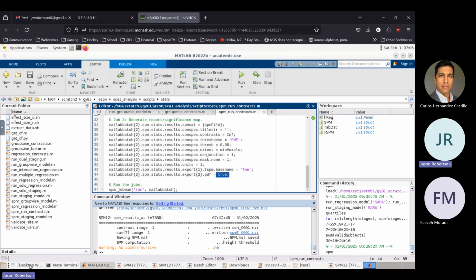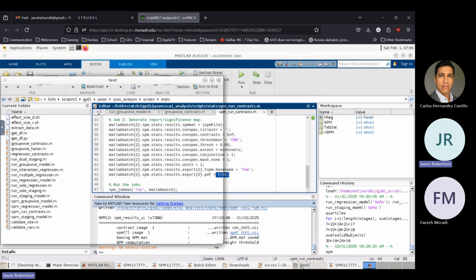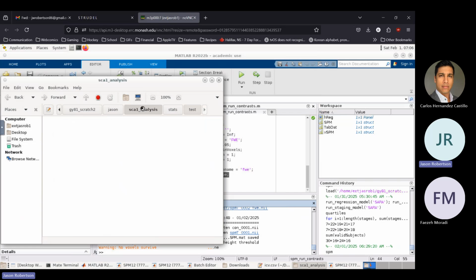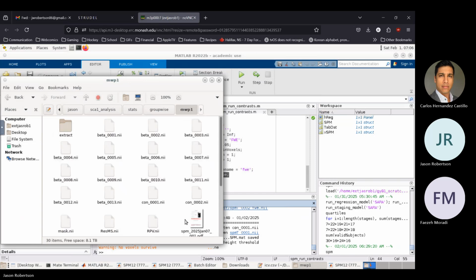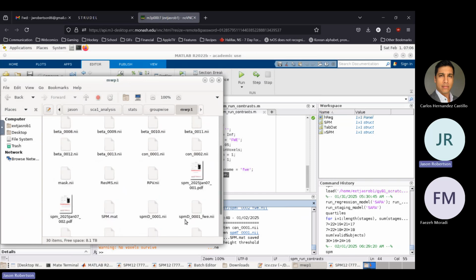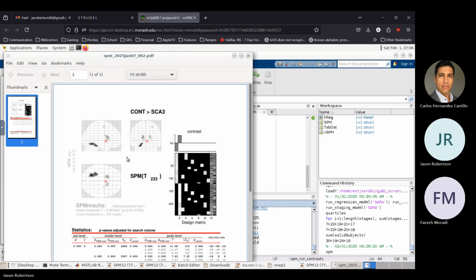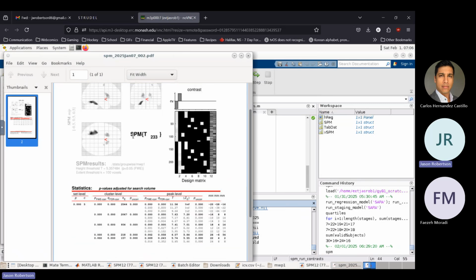And this will tell it to save the output as a PDF. And so we go over to what I got out with the analysis I ran with the scripts. You can see I've got the prop files here, and I've got the PDF files, and there's an error in the title, but it doesn't super matter. And you can see same areas, same data table, all that sort of stuff.